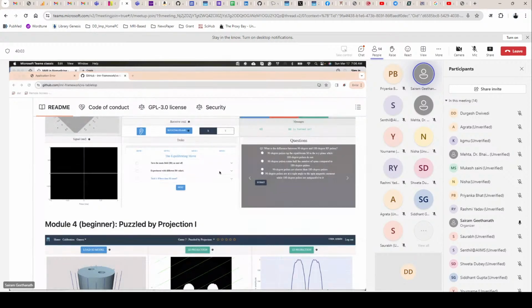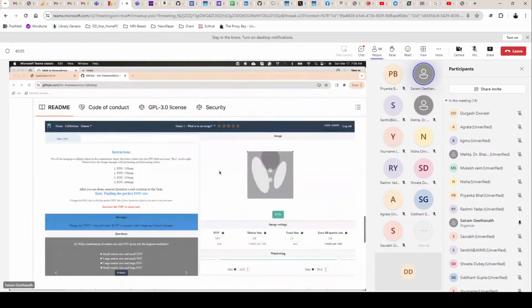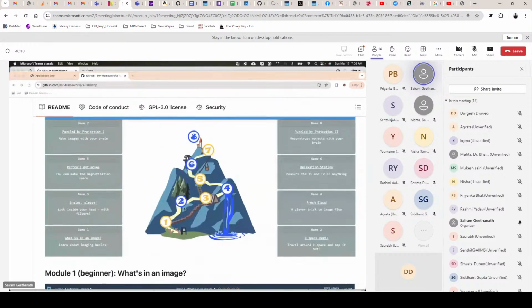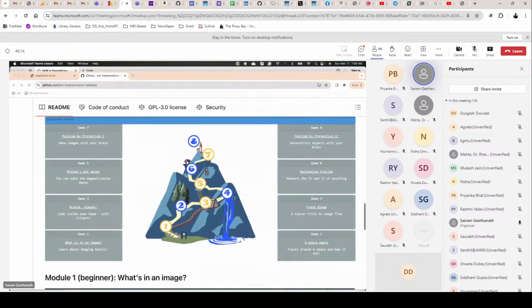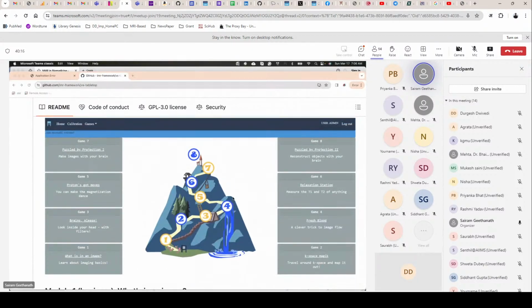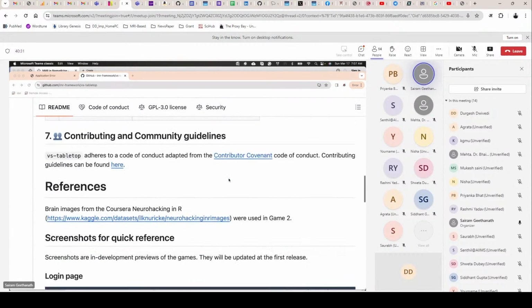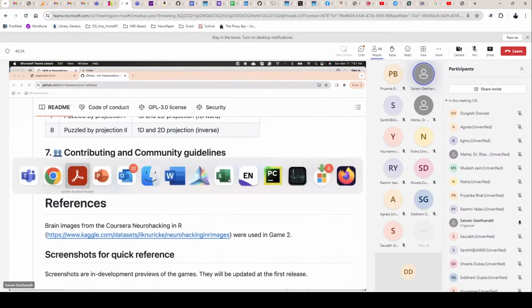So these are for beginner games. We also have advanced games for each of them. Those would be games 2, 4, 6, and 8, looking at the effect of K-space, flow, trying to see if you can actually map T1 and T2 of tissues, and then trying to do mostly an image reconstruction with projections. So those were the 4 games that I wanted to talk about.